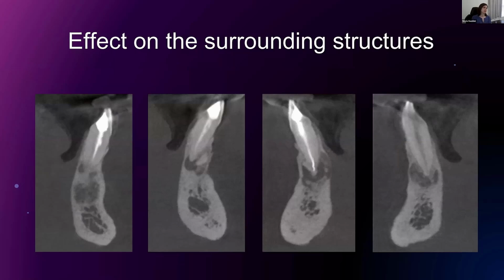Now, back to the periapical cemento-osseous dysplasia case. We can also appreciate how it's causing thinning of the cortices. Sometimes it can cause interruption, sometimes expansion as well. However, we rarely see root resorption in these cases of cemento-osseous dysplasia. And I would like to highlight the importance of analyzing the scan when we get it, because these entities do not really require any biopsy.